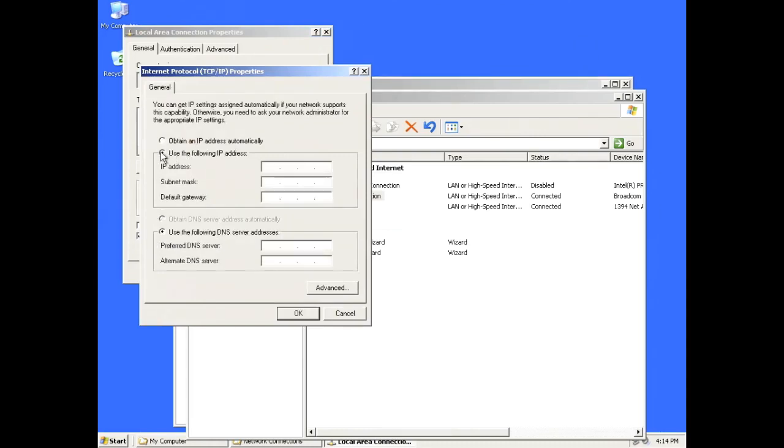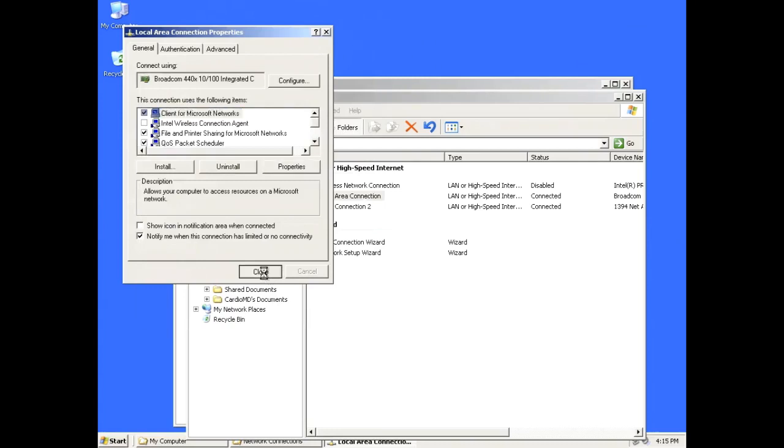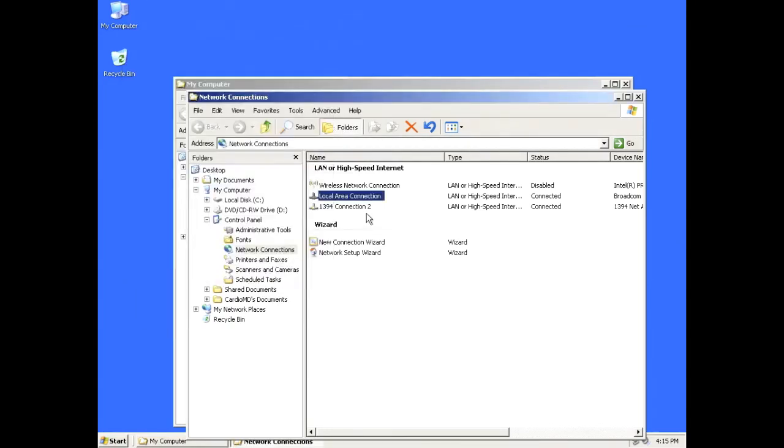So we're going to use 192.9.200.5 as a pseudo standard IP address for the CardioMD. That is the only information we really need to put in here. And I'm going to say OK and say close. Take a few seconds. The system is dealing with that. I can kill all my windows.